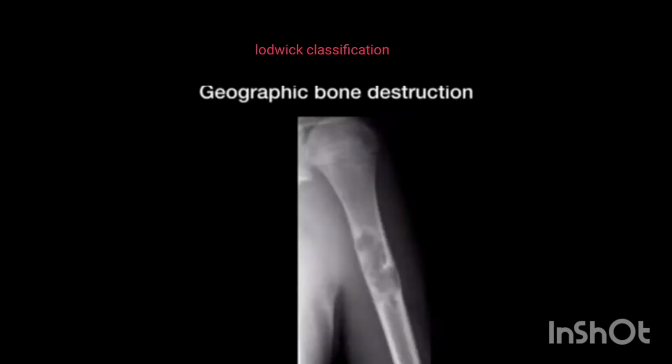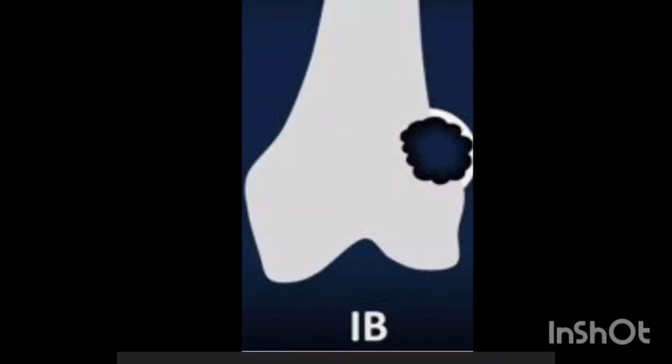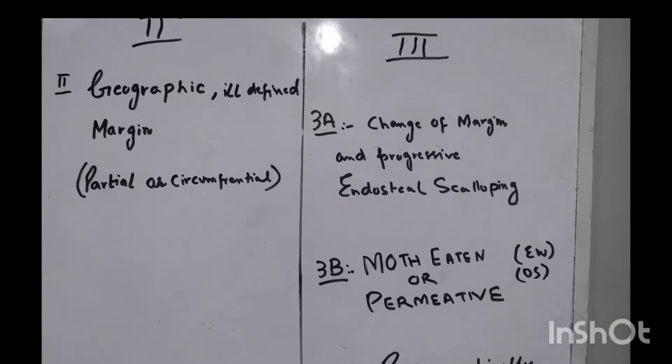This is an example of geographic type 1. This is an example of geographic bone destruction, and this is 1B. Type 2 geographic ill-defined margin, partial or circumferential example.